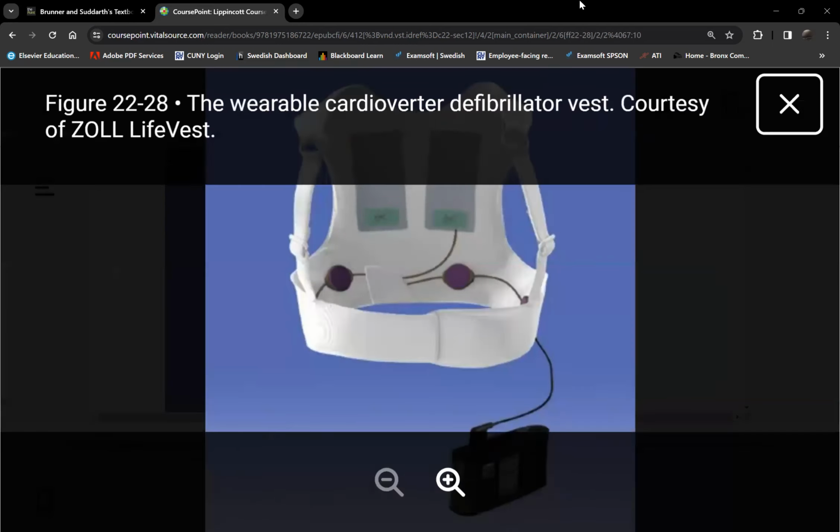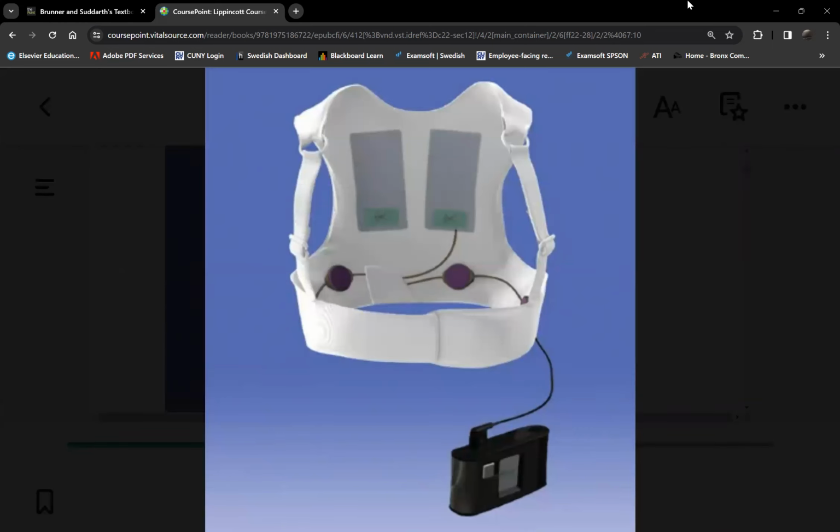Now, what are you looking at here? Remember the bridge we talked about earlier, the transvenous pacemaker? Why did the patients have a transvenous instead? What's a likely scenario? They have an infection wherein we cannot put in a permanent pacemaker yet, right? So this is the equivalent for the ICD. The ICD looks like a pacemaker.